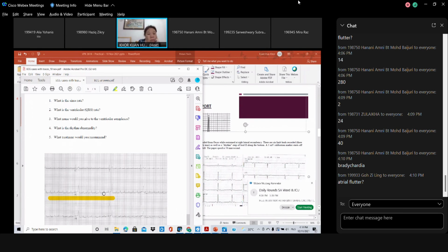Just now, what did you want to say? Ventricular something you mentioned. No, doctor, I just thought it was ventricular bradycardia. Oh no, this one there's something wrong. That's why the ventricle is not beating.